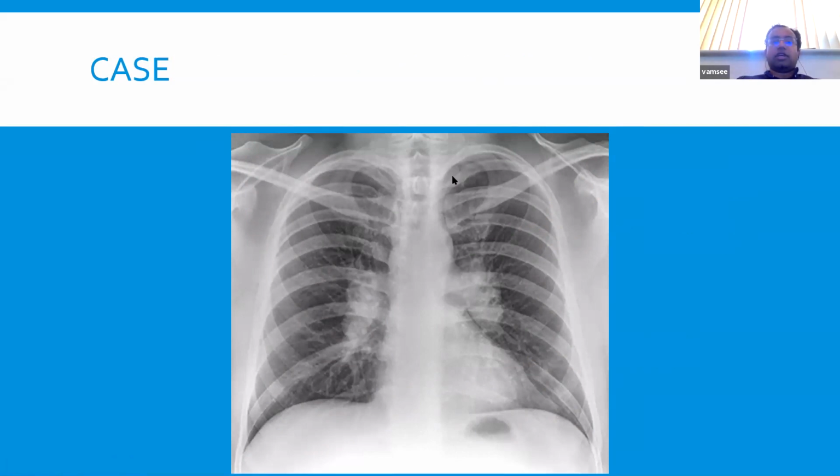So for this, I would say, again, the usual, this is a chest film of Mr. X, dated yesterday. Technically, it's an adequate film. There doesn't appear to be rotation. There appears to be adequate inspiratory effort. It seems to be slightly underpenetrated. While I can make out the borders of the spine, through the spinal lines I can't make out the individual vertebrae that well, so I would say it's probably slightly underpenetrated.